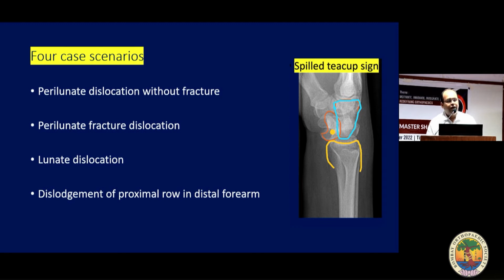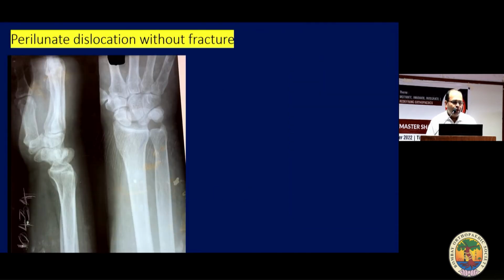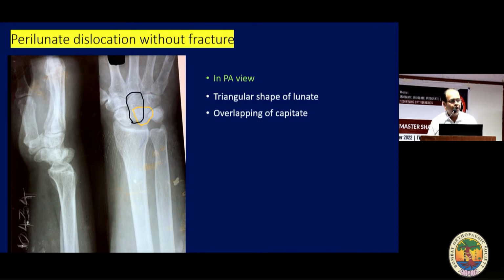How do we see that on X-ray? In a perilunate dislocation without a fracture, on the PA view, the lunate takes a triangular shape; usually the lunate is not triangular. If we see a triangular lunate overlapping with the capitate, that means there is a lunate or perilunate dislocation.